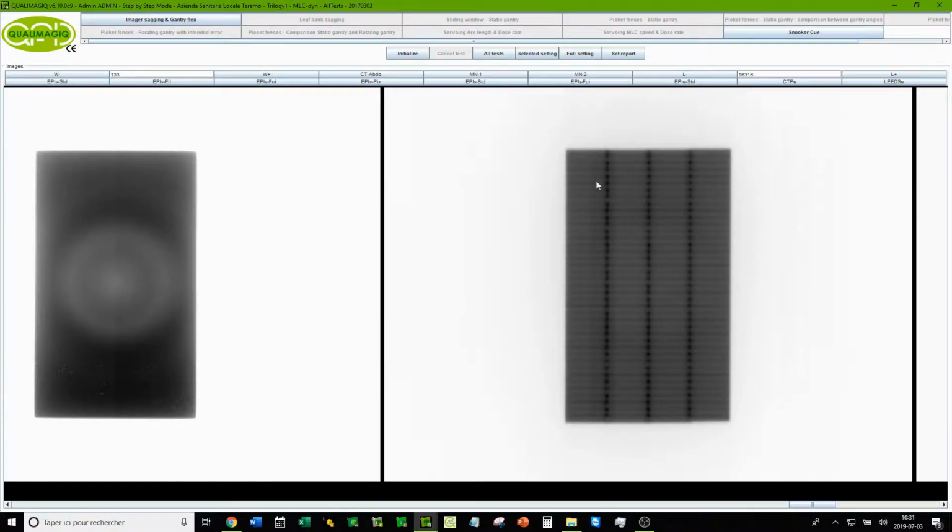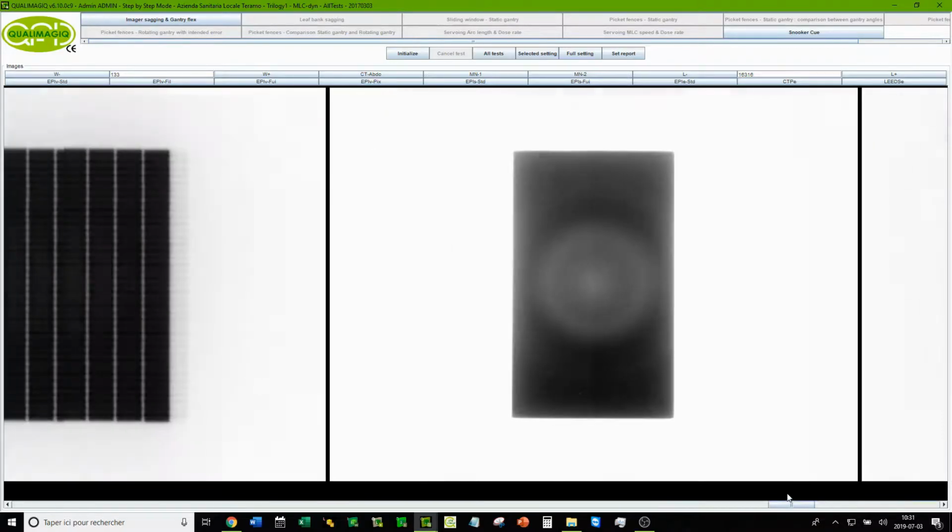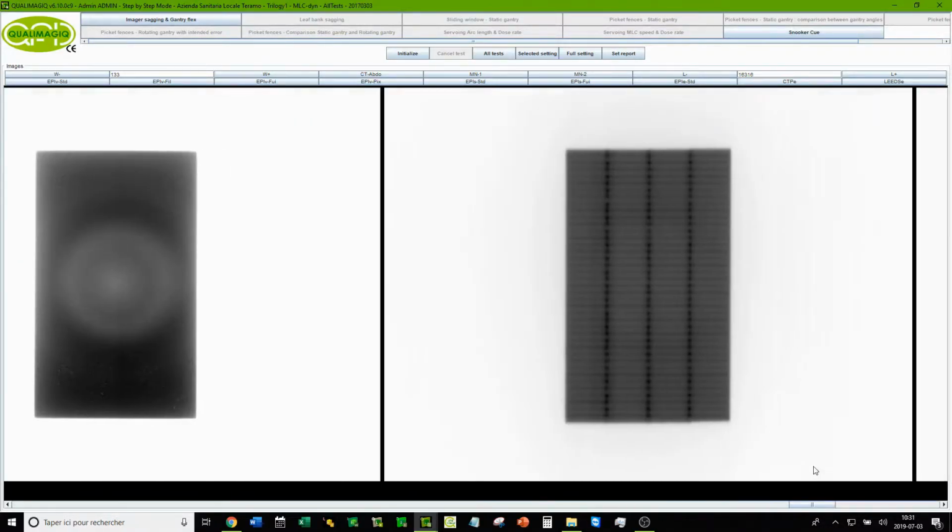The same goes for 4 leaf speeds. Again, with a rotating gantry. When the leaf speeds increase, the dose rate needs to increase proportionally.